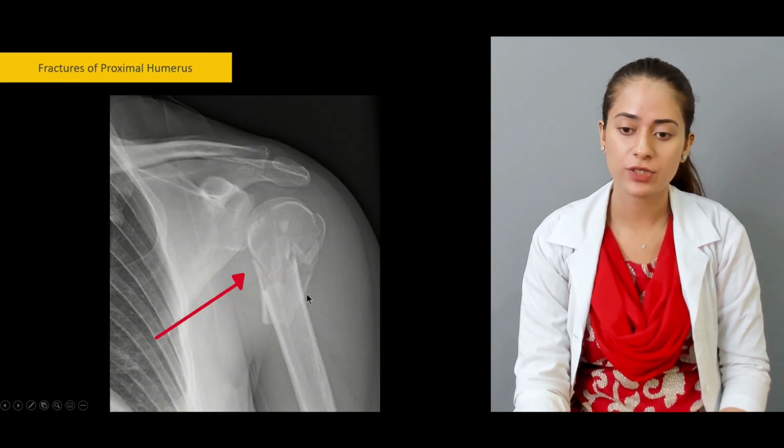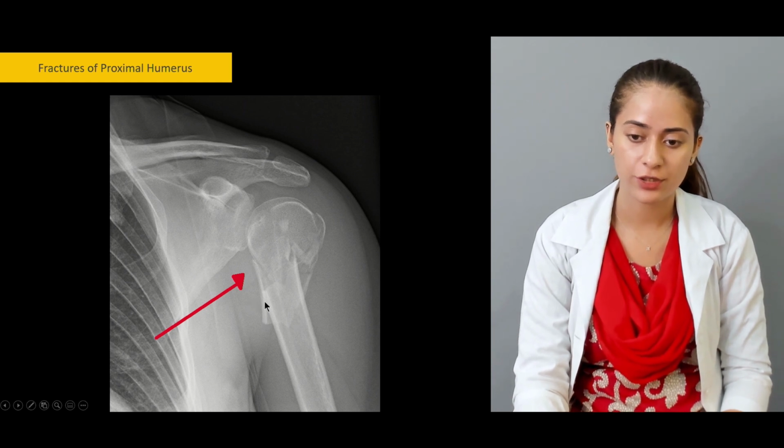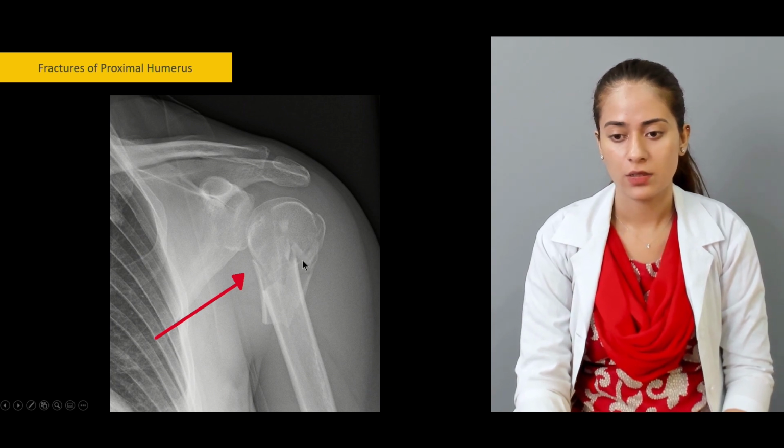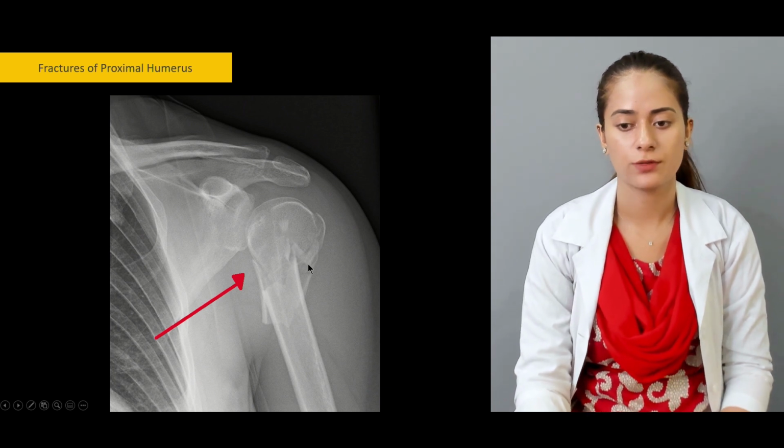This is a comminuted fracture. The humerus head and the associated piece of shaft is displaced posteriorly, and this is the rest of the shaft, which is placed anteriorly. It's displaced here, and it's a complete fracture, and there are fragments associated with this fracture. This is a fragment here. This is an irregular fracture, and this is a fragment right here.